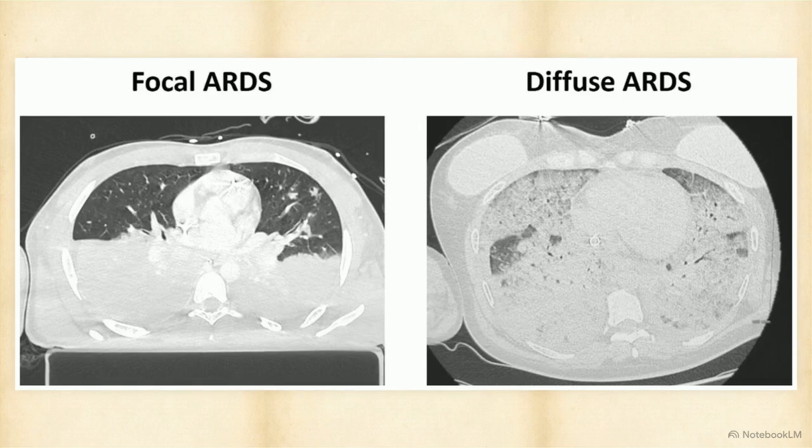These CT scans reveal the morphological reality. The left patient has focal dorsal consolidation. The right exhibits diffuse ground glass opacities. Applying uniform high PEEP yields starkly different results. Pressure rescues the diffuse phenotype by reopening alveoli, but induces lethal overdistension in the focal phenotype.